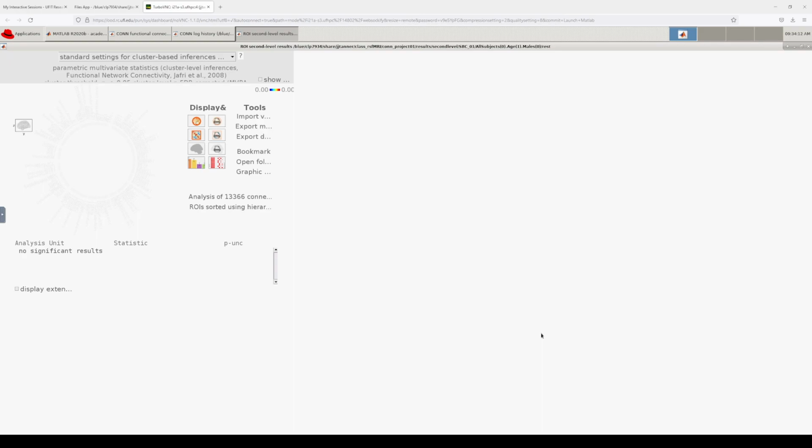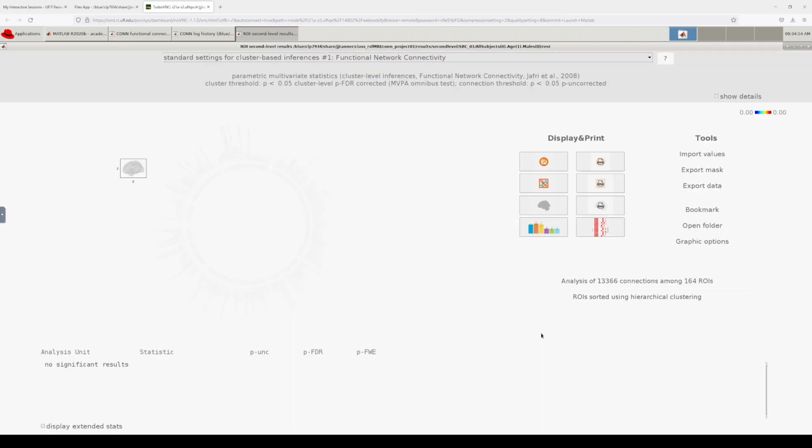But the downside of that is it's easy to point and click and do some analysis. And if it's not theoretically grounded or you don't have a pre-existing hypothesis, then you're just pointing, clicking, exploring, and that gets into, you're just kind of on a fishing expedition, and that's not necessarily good science. And so what I recommend is not doing that. We want to have specific analyses that we're going to do.